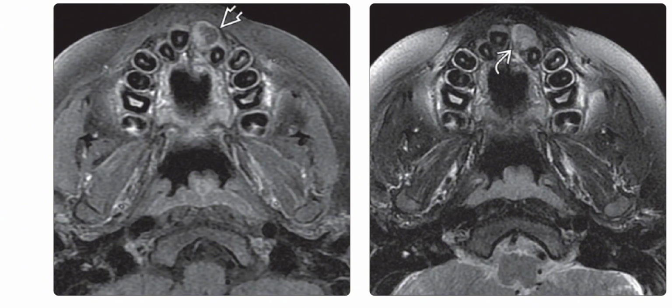Left is the axial T1 contrast-enhanced fat-suppressed MRI sequence in a 6-year-old child with the known case of basal cell nevus syndrome, and it shows a small cystic mass in the anterior left maxillary ridge, consistent with a keratocystic or odontogenic tumor. This cyst has a thin, faintly enhancing rim, and an unerupted tooth medially is also noted. The MRI was performed as a screening test for medulloblastoma.